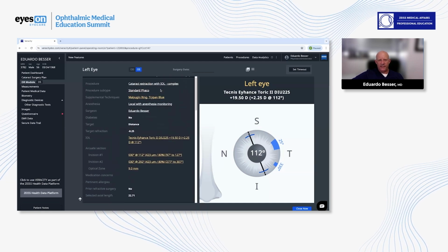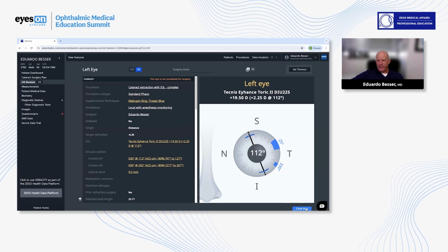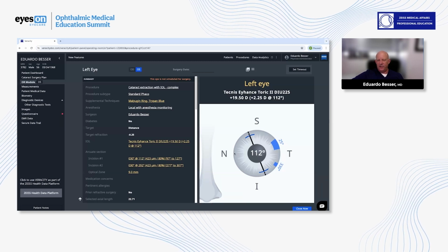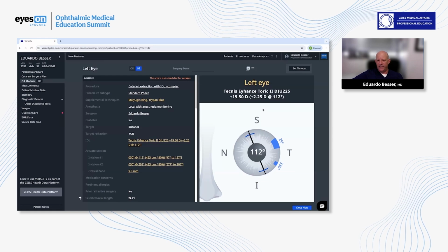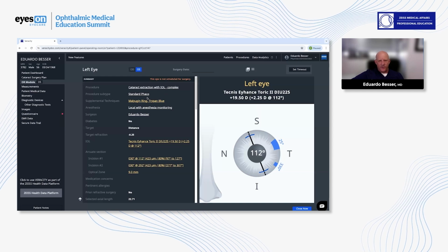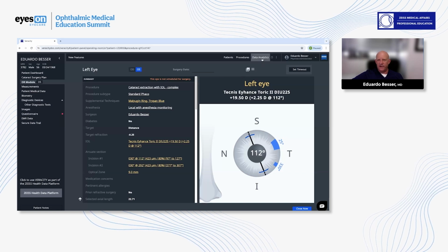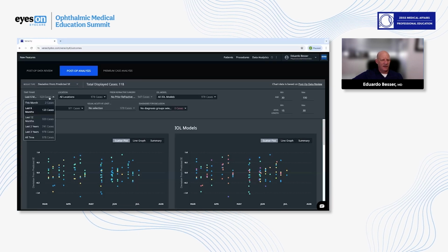And once you have completed surgery, you click on Close Now. When you click on Close Now in the OR, well, I have my computer in the operating room, Veracity now knows that this is the lens that I used, and this was my plan, and it knows the expected refractive outcome. One month after my surgery, we do a refraction in the office, and my EMR system syncs directly to Veracity. So we can very quickly do a data analysis. This was previously impossible.